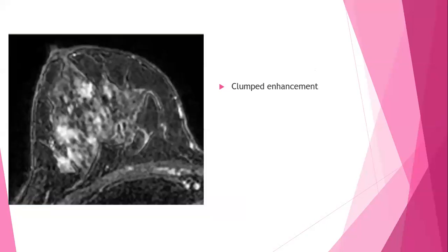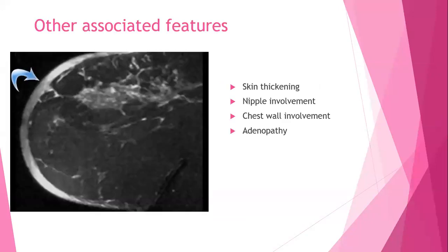We can have clumped enhancement. So again, you see the bright areas on the screen in this image clumped together. So again, this is a mass that would be suspicious. You may have multifocal disease in this case.